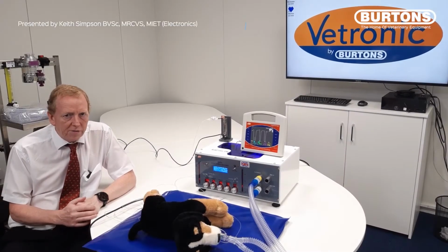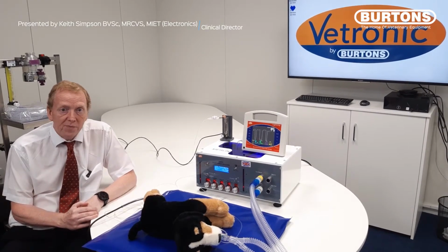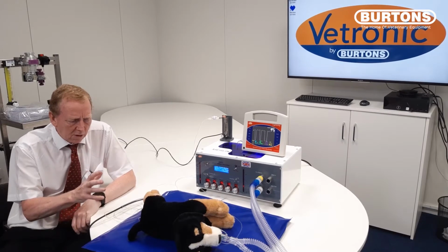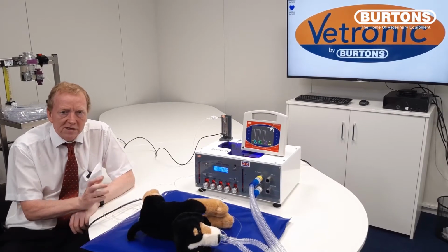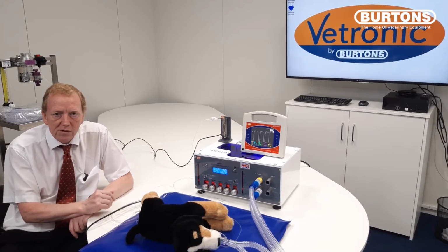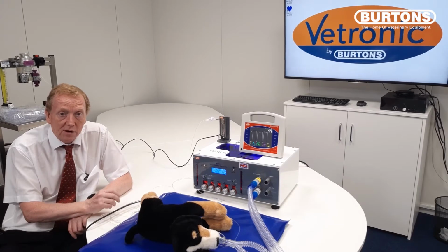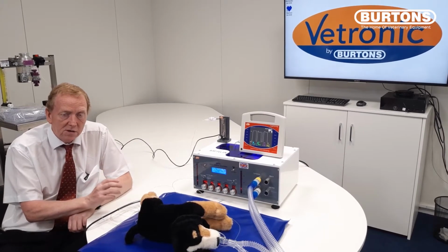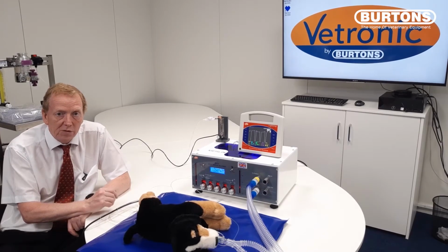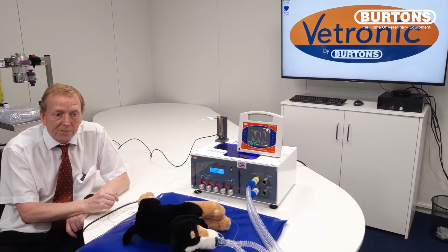We're now going to look at the effect of changing the minute volume on the end tidal value for the expired CO2 from our anaquin model. The whole concept of the anaquin model is that CO2 production in an animal, be it a dog or an elephant or a horse, is at a constant rate, particularly when they're anaesthetised and lying on a table at a constant temperature. So we have a constant CO2 production within the body, and if we have a constant CO2 removal from the lungs, we'll have a flat level of normocapnia.